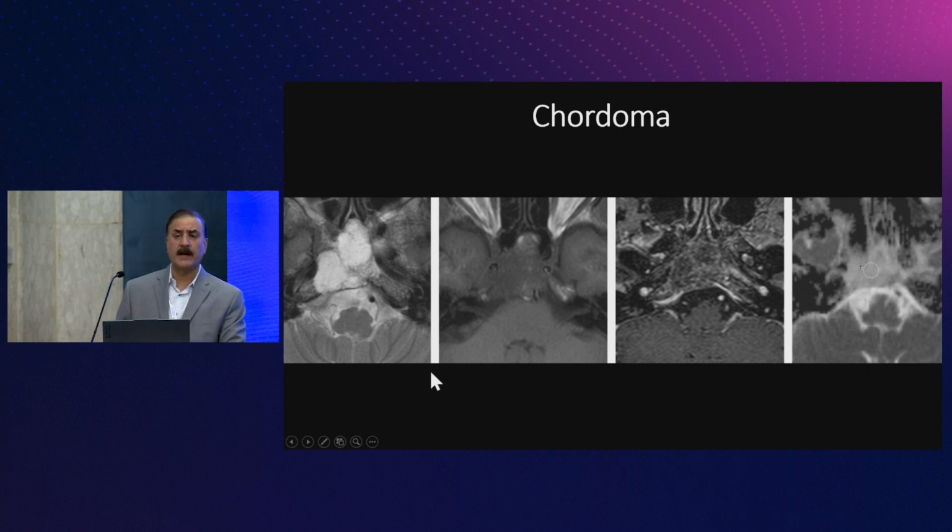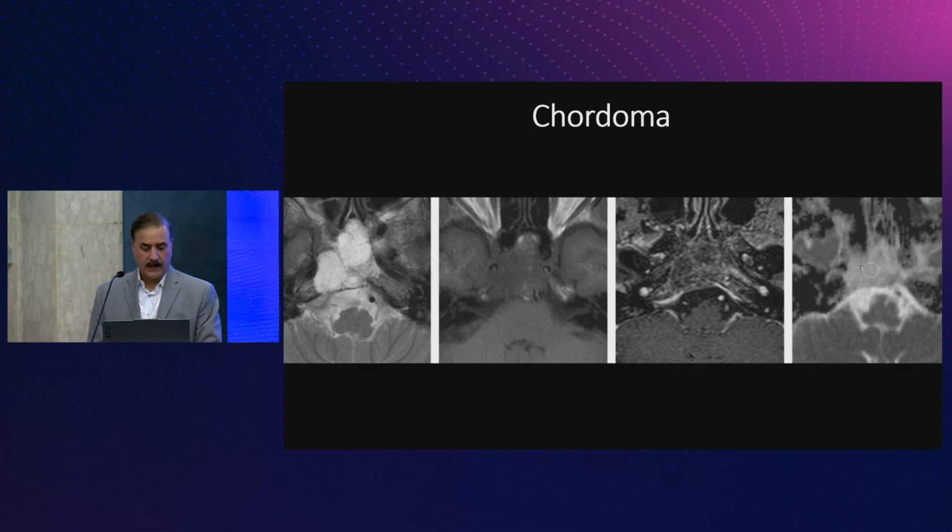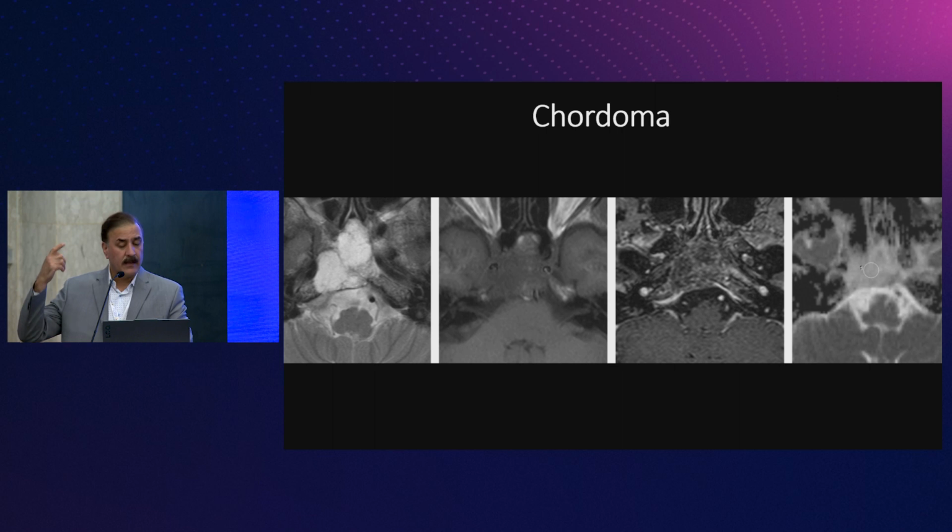We do a lot of diffusion-weighted and perfusion-weighted imaging on chordomas. Hopkins is a chordoma hub, and we get to see a lot of chordomas. So we're doing a lot of diffusion imaging and ADC. This is one of the tumors that has perhaps been most studied on ADC mapped images because our numbers for bone tumors are not as robust as we know in the brain. So we are still looking at this. But if I see a bone tumor that's bright on T2 that has ADC value anywhere between like 1200 to 1600, I'm thinking of chordoma.